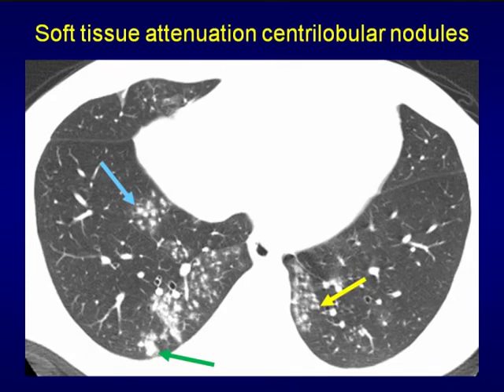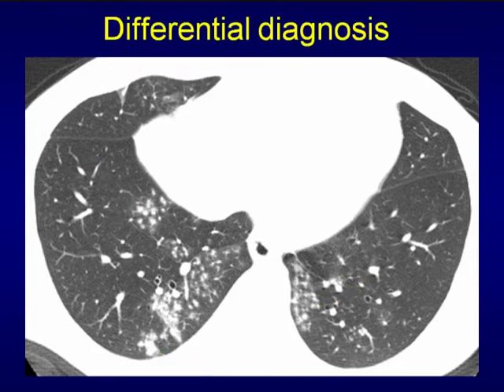Some patients will look like this and just have these nodules, which appear denser than the first pattern of the ill-defined central lobular nodules. And so we include this as a separate category, but very closely related to the tree and bud category. You can see a nice example of nodules of different sizes, smaller nodules, somewhat bigger nodules as they start to fill up that entire lobule, and then very large nodules almost filling up a pulmonary lobule. So this is different stages of evolution in someone who had a basic old bacterial bronchopneumonia and did not have tree and bud here or anywhere else.